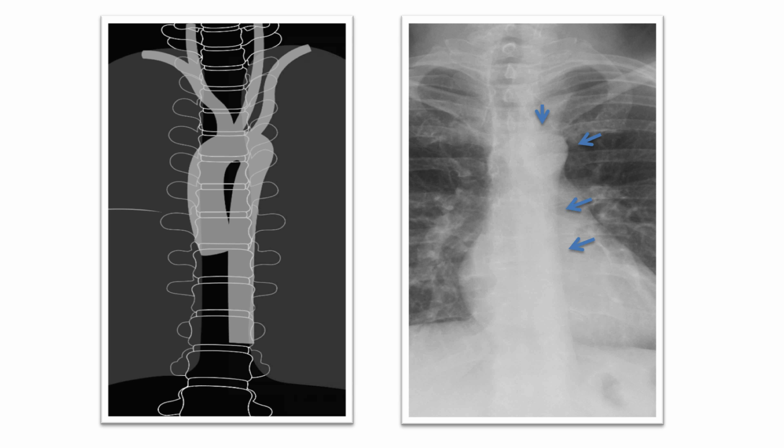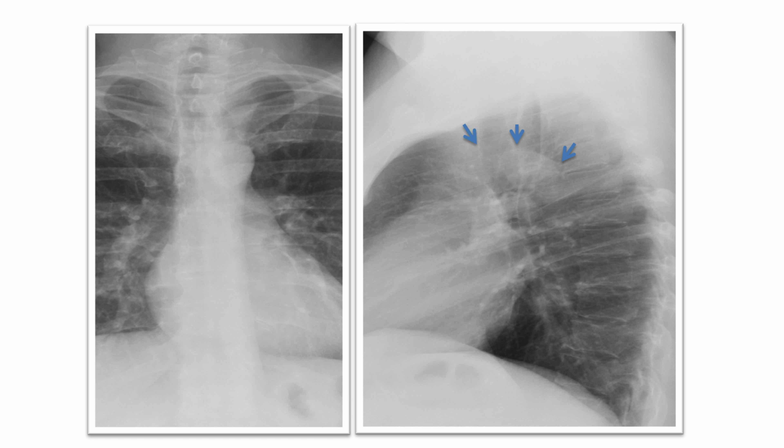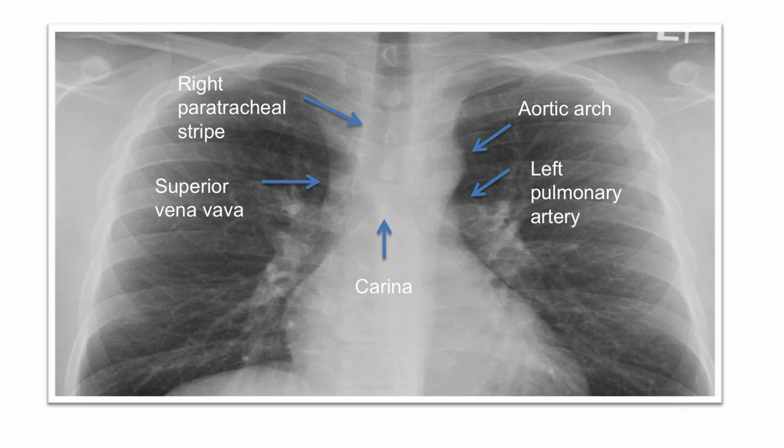The reason we don't see the medial border is because the medial border of the aorta is silhouetted with other anatomical structures within the mediastinum. The aortic arch can also be seen on the lateral X-ray as a white arch coursing from front to back. Because of its shape and grayscale, the trachea can be easily identified on the chest X-ray.